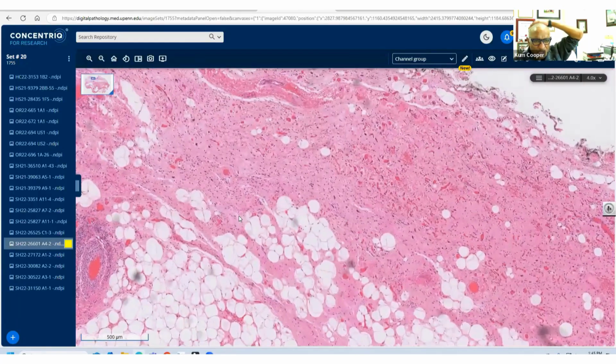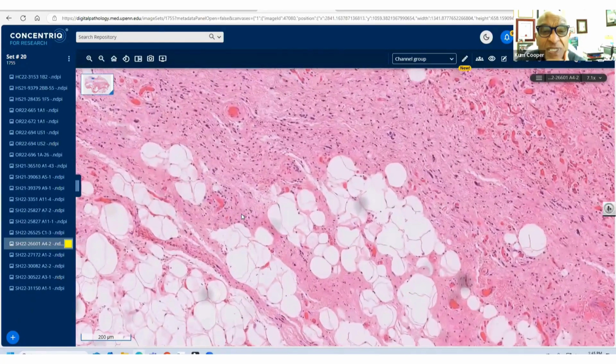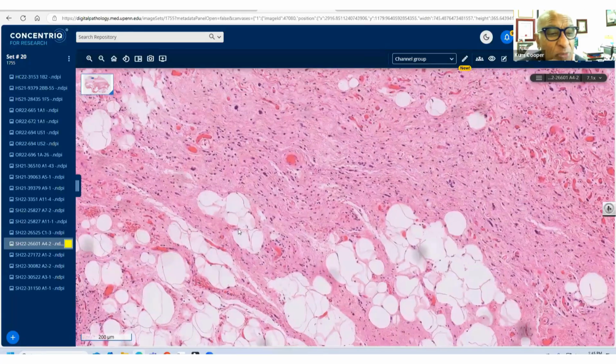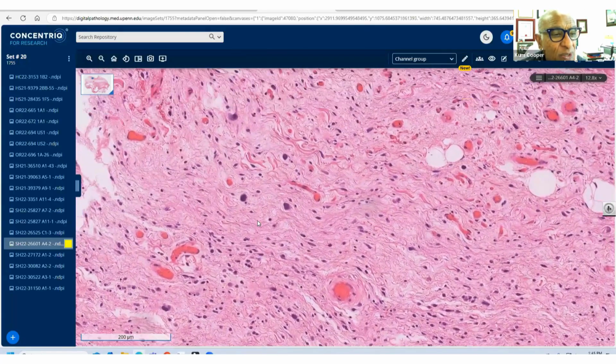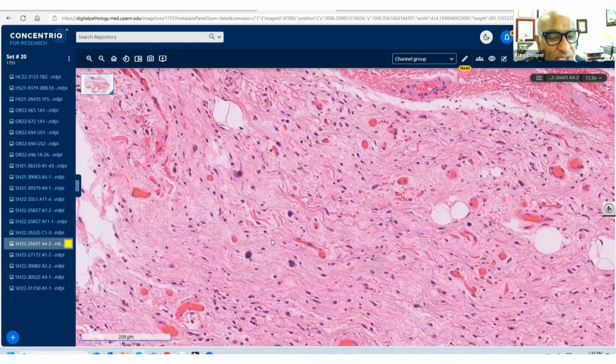So Florence mentioned the ropey collagen, which is a good thought. Now, typically ropey collagen is a little like this, a little more thicker. So that's a good thought, right? And that's what ropey collagen means.